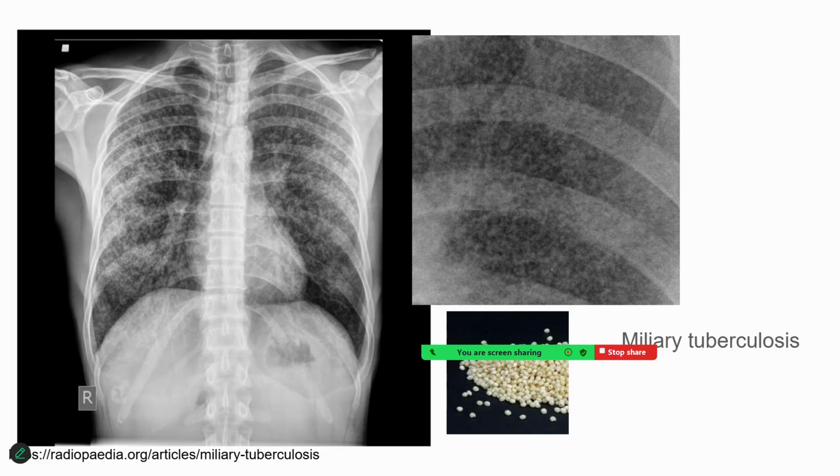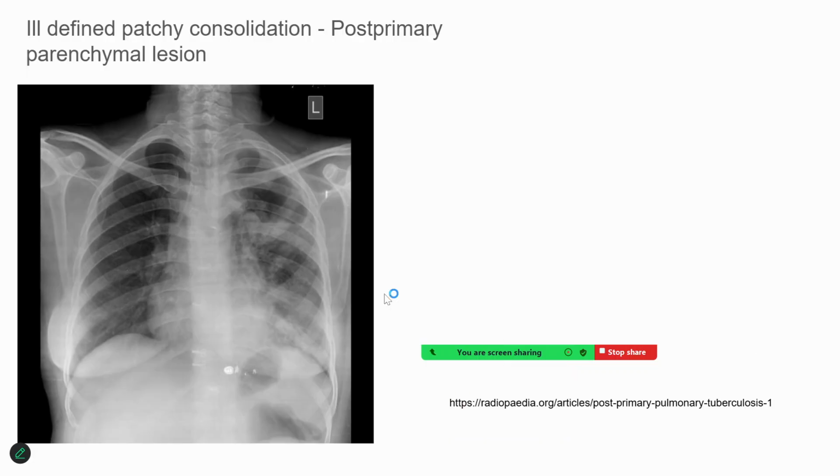Now, another condition which is seen more frequently in primary tuberculosis is miliary tuberculosis. Miliary tuberculosis is due to a sudden rapid development of the course of the tuberculosis, where there would be a rupture and the hematogenous spread of the lesion, and hence a wide area of the lung tissue is involved, and you will find very multiple spots. As if some grains are spread over, it is just an exaggeration of the mottling, with widespread areas seen. That's what we call miliary tuberculosis.